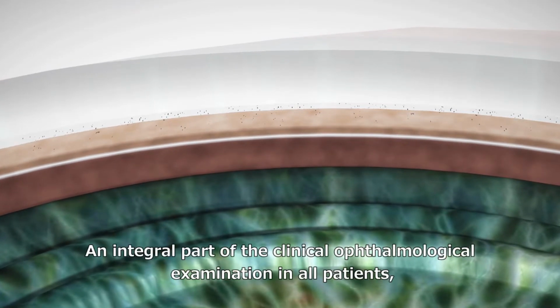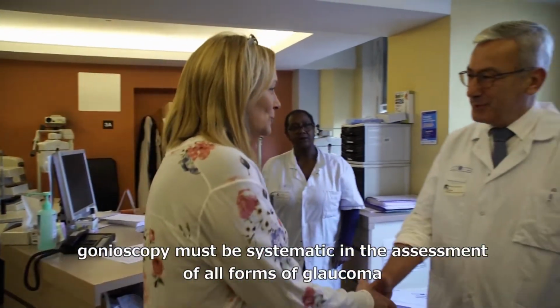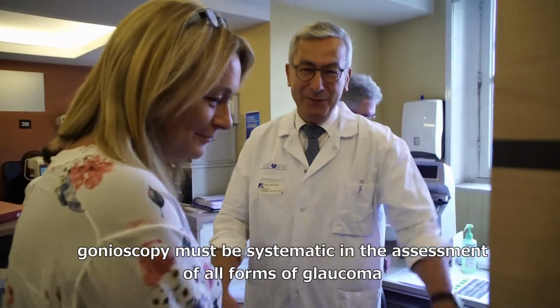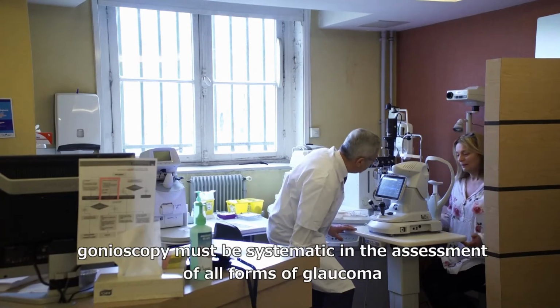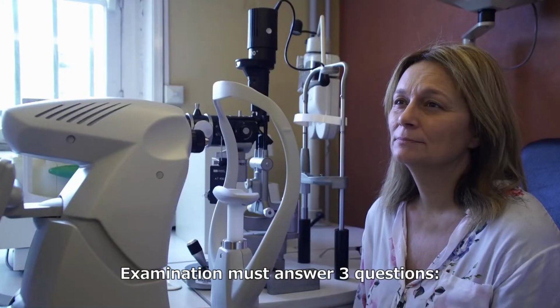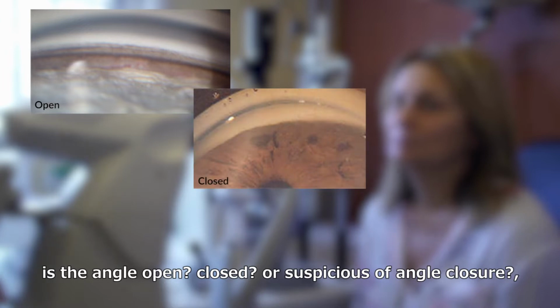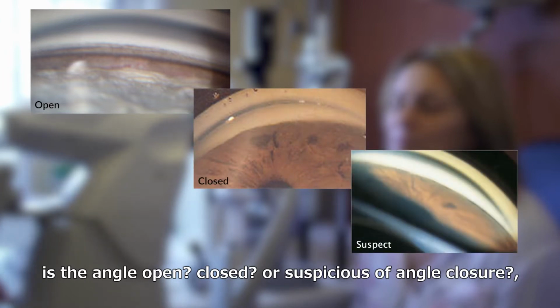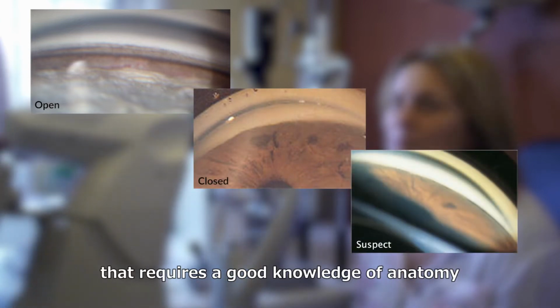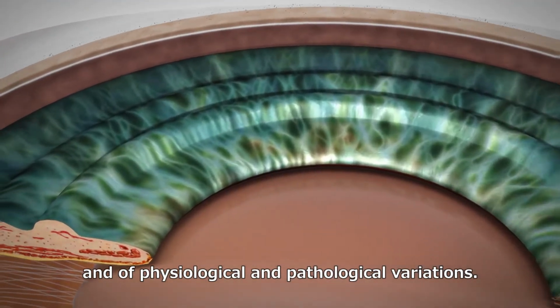An integral part of the clinical ophthalmological examination in all patients, gonioscopy must be systematic in the assessment of all forms of glaucoma and any suspicion of narrow angle. Examination must answer three questions: is the angle open, closed, or suspicious of angle closure? This requires a good knowledge of anatomy and of its physiological and pathological variations.